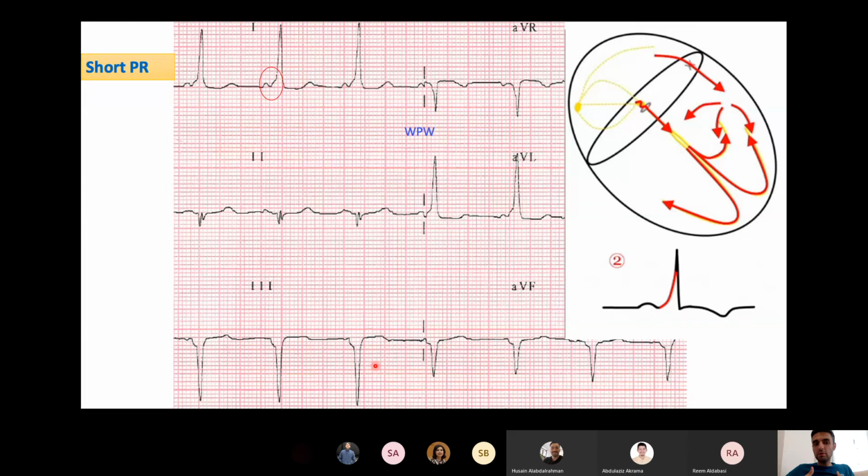But this patient has WPW, hence the appearance of the QRS, not because the patient had an inferior scar. So WPW really messes up your ECG, but everything would be back to normal once the accessory pathway goes away with ablation. Make sense, or is this difficult? Makes sense.